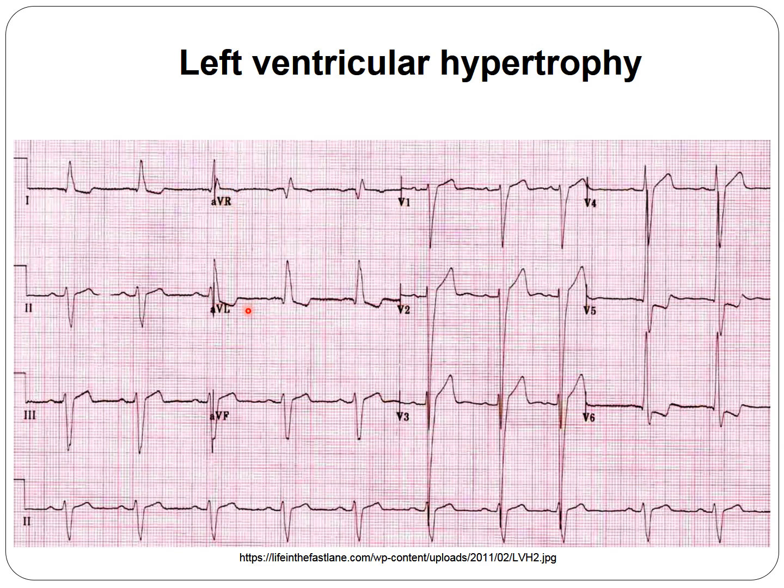Next ECG tracing. The rate is 1, 2, 3, 4, that's around 65. That's a sinus rhythm. In the morphology, the P is okay, the PR is normal, and the QRS is a little bit wider. I would say that is wide because it's more than 0.12, so that can represent a depolarization delay in the ventricle. Looking at the axis, it's extremely left deviated.